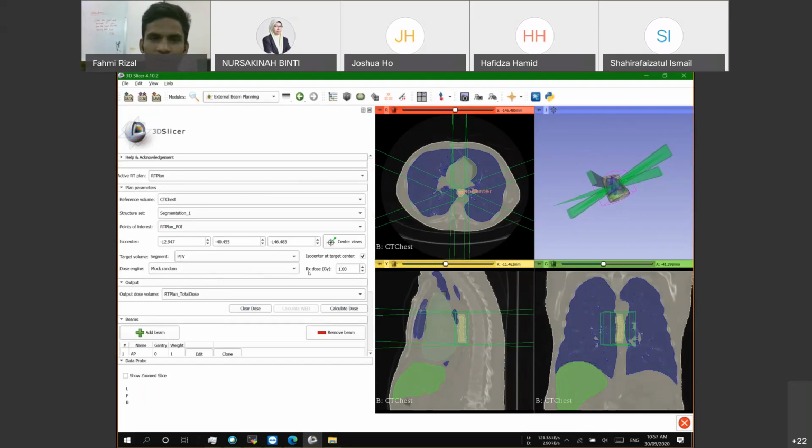for the radiation treatment you can apply the dose here. Some of them just apply the fractional dose. For one fraction for esophageal cancer, I think it is between 1.6 to 2 gray per fraction. So I think I will just put 2 gray.